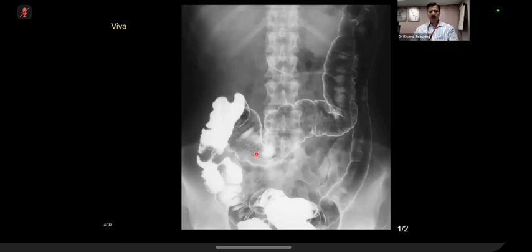So are we concerned about the descending? Is this transverse colon normal? No, this is not normal. There are multiple polyps, which look like pseudopolyps. So in differential, we may include ulcerative colitis. Okay, fine. Thank you. So you can mute yourself.